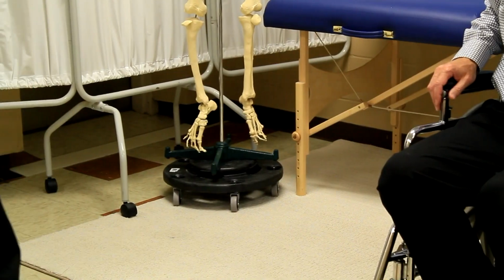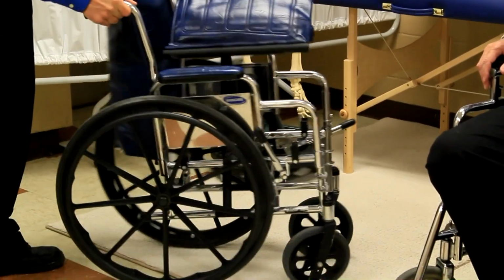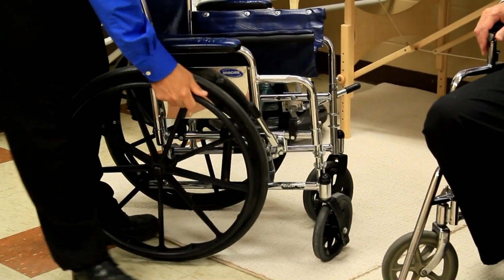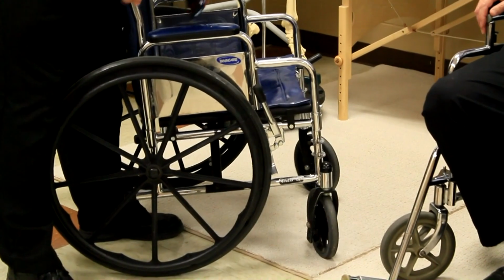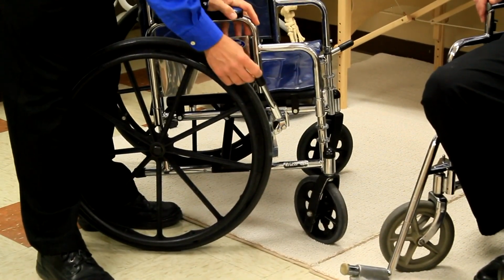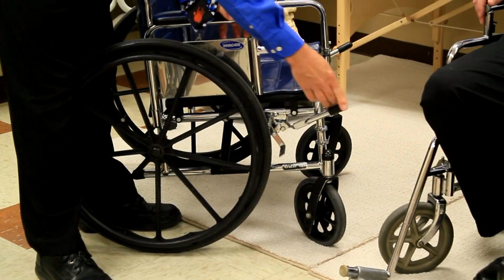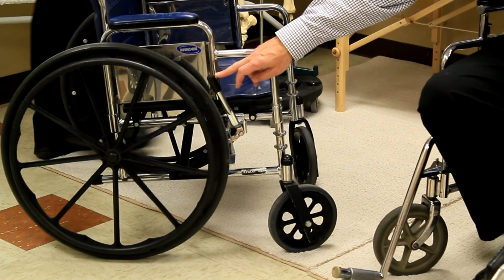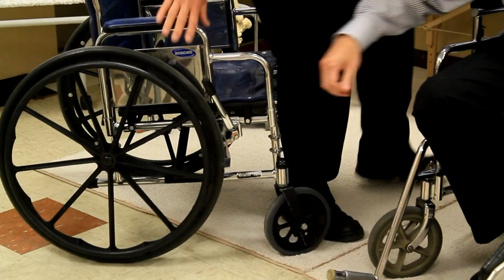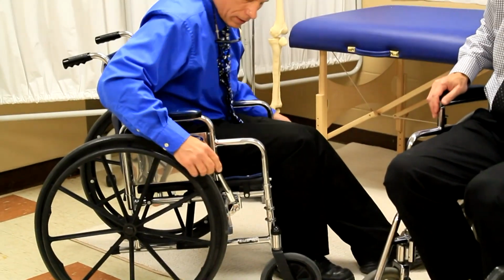And I'll show you this chair right here. Brad and I were talking, even for those who do have strength, I'll tell you, these brake extensions are nice. Right, here we go, let's pull this chair out. And this looks like a 4 or 5 inch extension. They come longer than this too. And much easier, more control to get that brake on. You can use this on any wheelchair. You just pull it off, but these are on pretty tight, I can't get them right off now. I think someone tapped them on a little too hard.